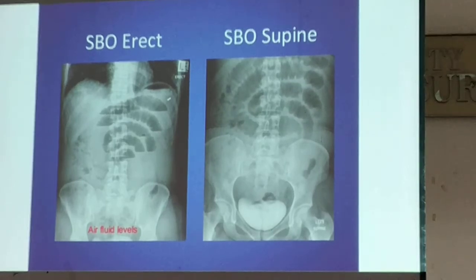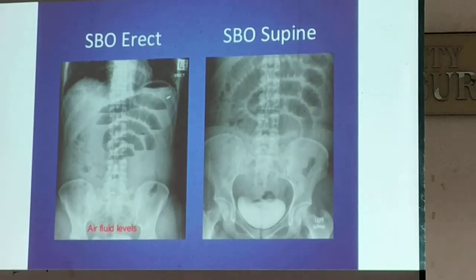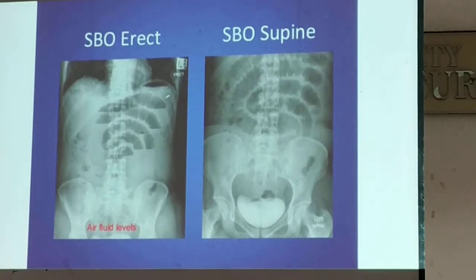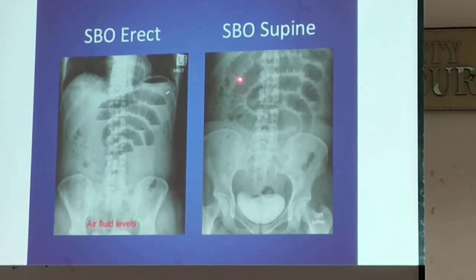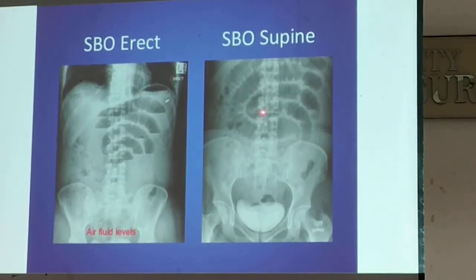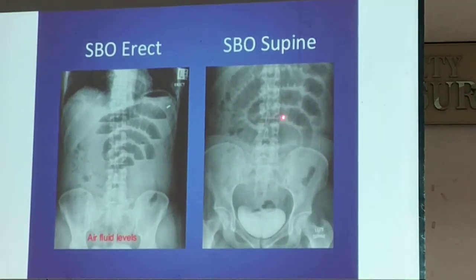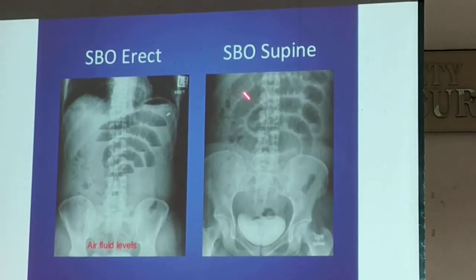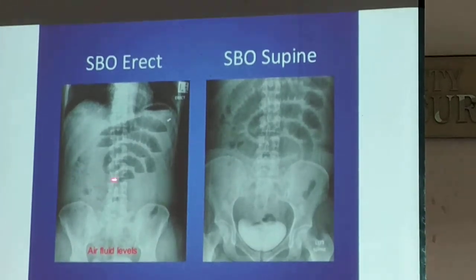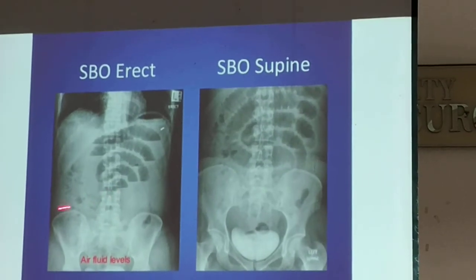Okay? So as I've said, the patient probably is suffering or experiencing pain. Probably there is an obstruction. That's why meron siyang ileus. You cannot say that this is a small bowel obstruction. Okay? Not unless you would do your upright film. This should be the upright film, the erect. You would see the air fluid level.